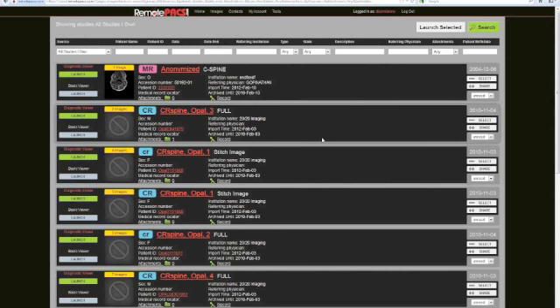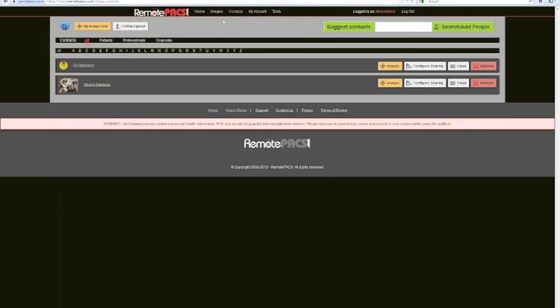We can add them to a predetermined automatic sharing program where any studies that match a certain criteria will automatically be shared. I think now is probably a good time to take a look at that. So we can see who we can share with by clicking up at the top of the screen. We have Contact. Now, here in the contact area, we have 2 connections. One's with Dr. Hutchison, and one's with Dicom Solutions.